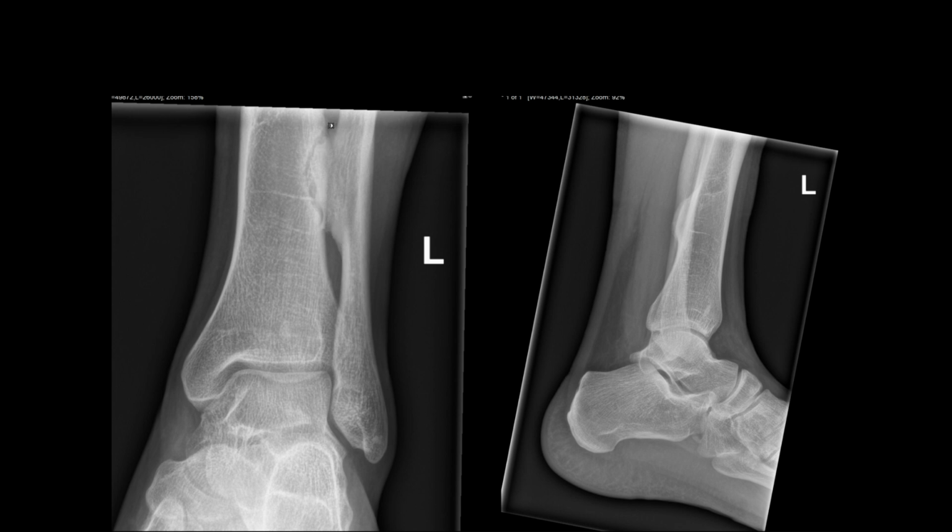However, the bone is causing compression on the adjacent lateral cortex of the distal third of the tibia, resulting in smooth bone remodeling of the distal tibia. The distal tibia is showing sclerosis along the region of the mass. On the lateral view, the lesion is seen similarly and is very well defined. There is no soft tissue component. So this is the radiological description.